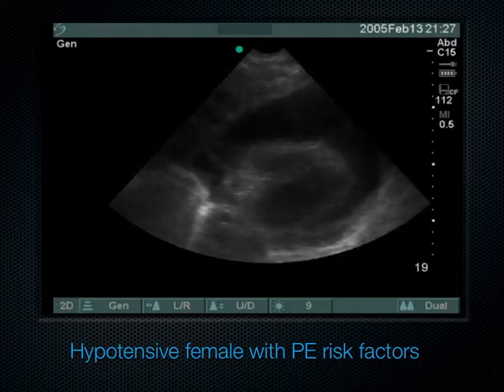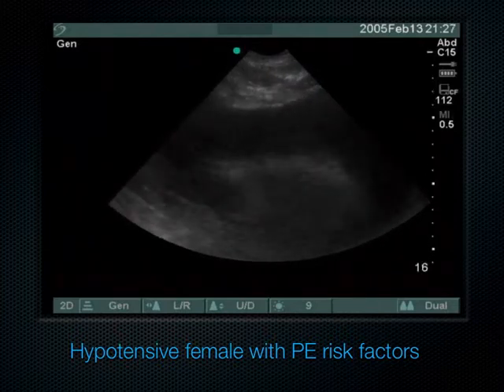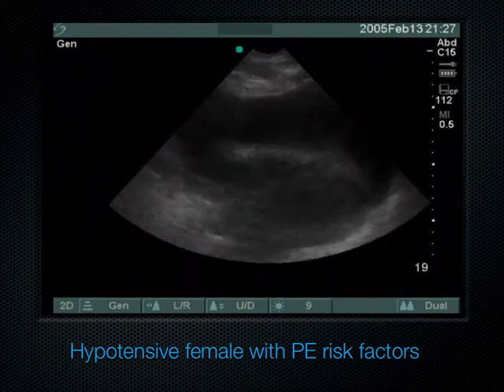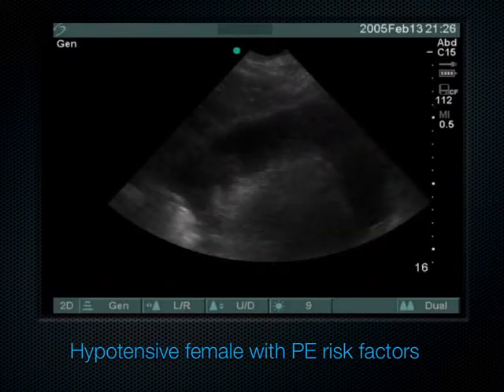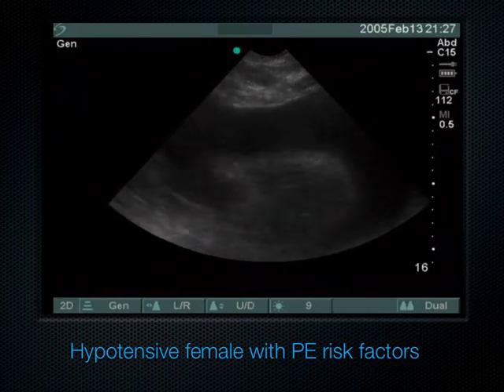What does this patient need? Pericardiocentesis. So, this was a real case. Maybe it was just me being a poor clinician, not being able to figure out the difference between PE and tamponade in a hypotensive patient. Or maybe everybody would have struggled with that and been led down the wrong pathway. It really looked like PE to everybody in the room, but we were all wrong.